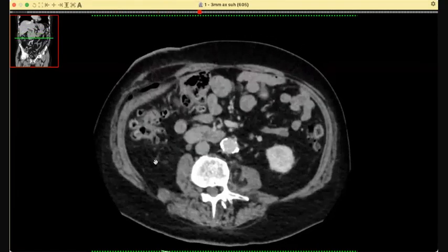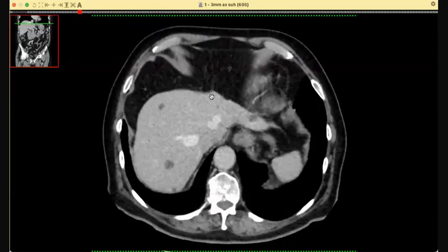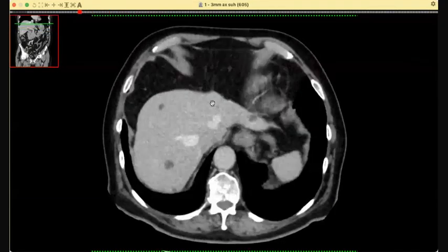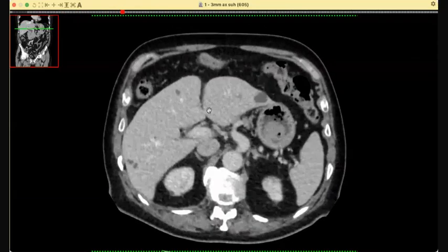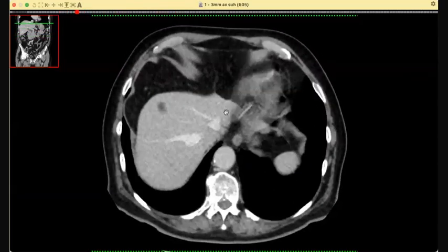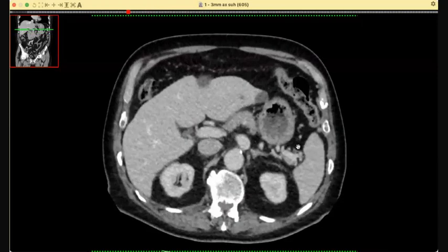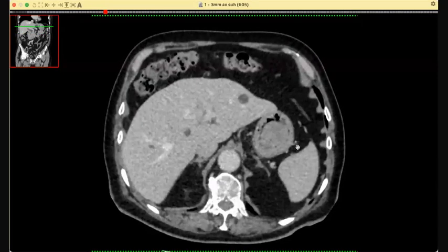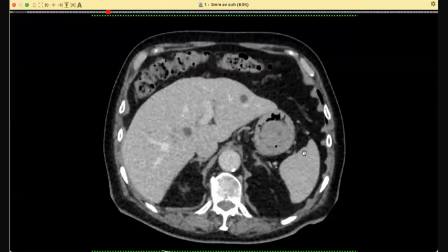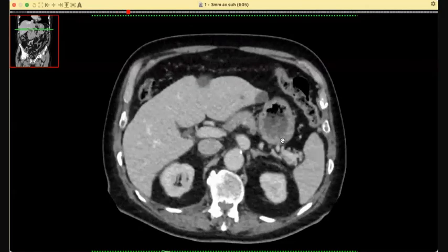These are all simple cysts. These are not metastasis. If you have got doubt, you should not jump to the conclusion that these are metastasis. You can also say that I can use Hounsfield units, etc. These are all cystic. But it was a satisfaction of search type of case where actually there was a second malignancy. There was a CT scan done for this patient 1 year ago, retrospectively speaking. On that one, this was present, but smaller and poorly seen, but here it is definitely seen.